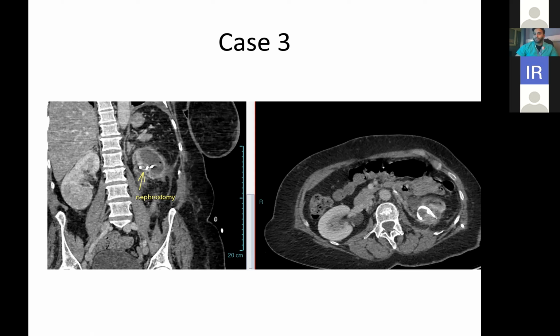She did actually recently come to one of our fluoroscopy lists for a nephrostomy catheter exchange, or a drain exchange. It's a slow recovery. Like I said, she was really, really sick with this, and this is obviously still putting out infected pus and things like that. With regards to her history, I don't think she's a fit candidate for surgery. But certainly continuation of our care and management of her ill health and her journey is quite satisfying from the radiology side of things.